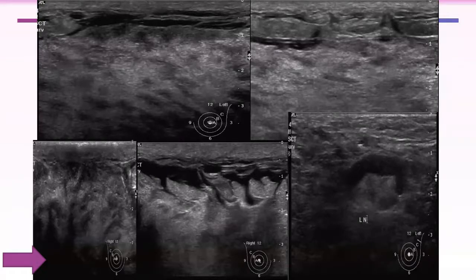Could be a malignant process. Malignant process, excellent, like carcinomatosis involving the lymphatics and leading to lymphatic obstruction. Excellent. Well done. Could this explain these hypoechoic areas in the breast? It can explain the bilateral edema due to lymphatic obstruction by metastatic axillary lymph nodes.